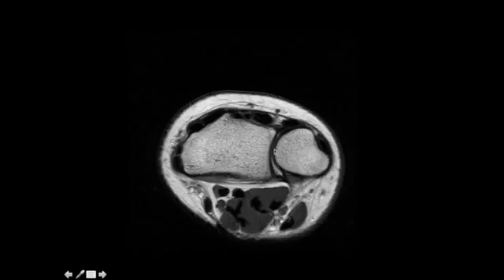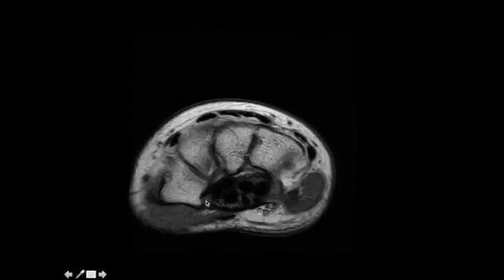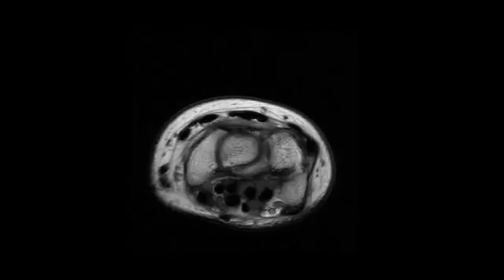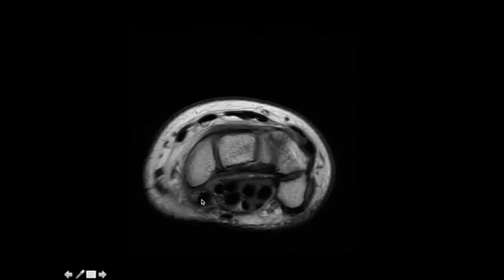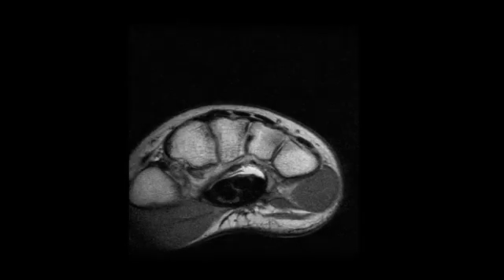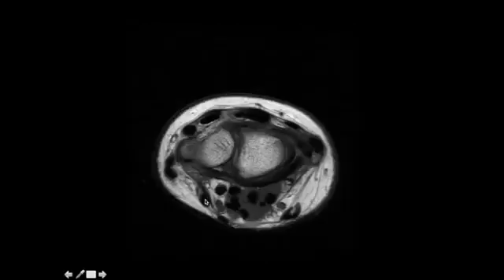This is the distal radial ulnar joint, and along our flexor aspect, we have the tendon of the flexor carpi radialis. Here, the flexor carpi radialis will insert into the volar or palmar base of the second metacarpal. It's here, and we'll see it best on our sagittal imaging.